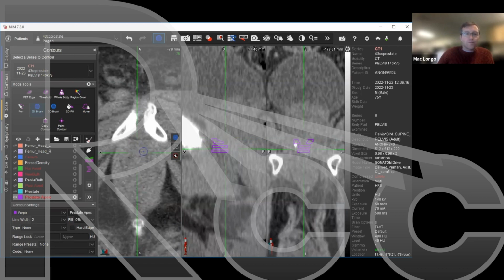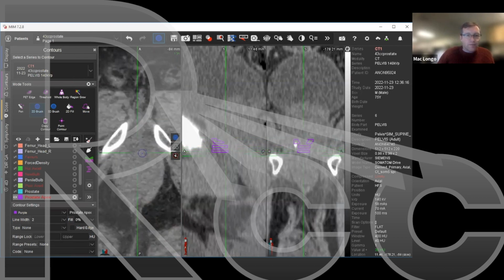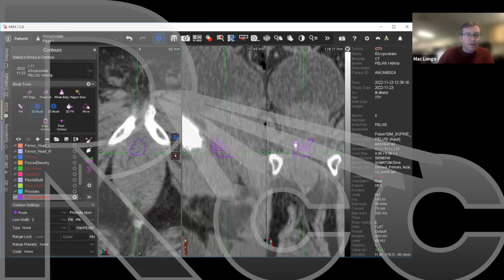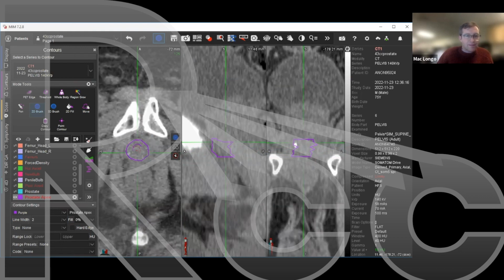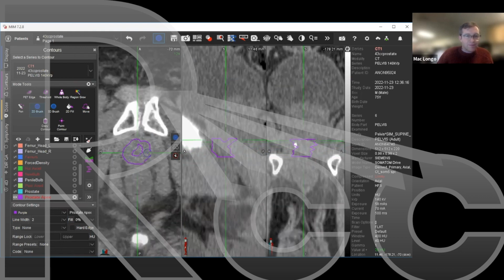And when we are unclear on the distinction or delineation between the genitourinary diaphragm, the muscle, and the prostate, what can often happen is we get this pedestal. I'm just contouring very roughly here, but you see that now we're getting more into prostate here. Okay, much more clearly, we're in the prostate, and I'm doing this roughly for you all. So here, I think we can all feel pretty comfortable.